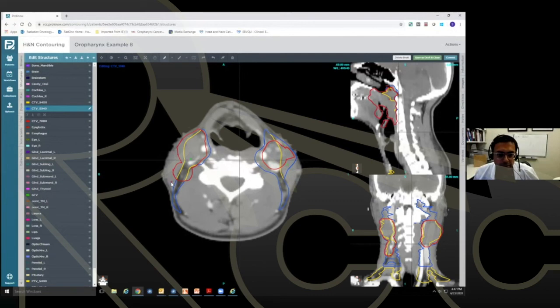Same thing on this side. You could cover. I'm not as worried on the medial aspect. You don't see paravertebral muscle invasion as much, but if you're worried about medial invasion of the paravertebral musculature, then you would also want to include that.